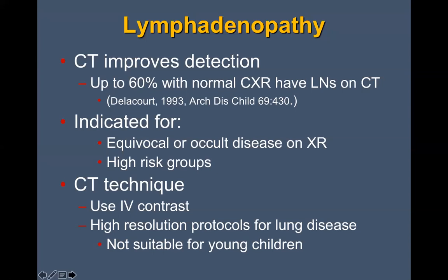If you're going to do CT of the chest looking for lymphadenopathy, you absolutely have to use IV contrast. Non-contrast CT of the chest, just everything mushes together in the mediastinum and you won't be able to distinguish lymphadenopathy from the heart and vessels.